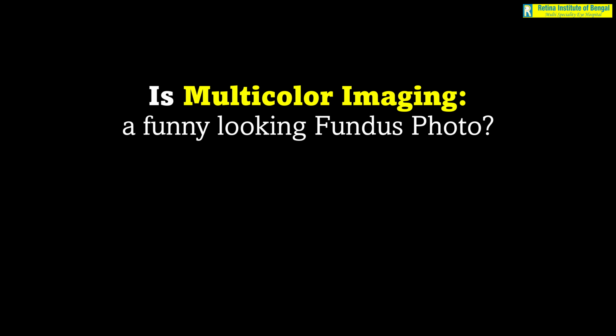But now after I have explained to you why a multicolor image appears the way it does and the great advantages it has over color fundus photo, I'm sure you will agree that a multicolor image is not to be confused with a color fundus photo. The two are totally different. And therefore, the answer to this question is a loud resounding no.